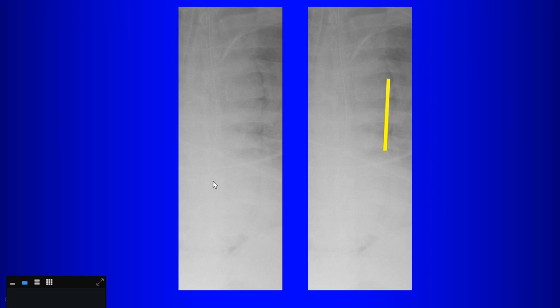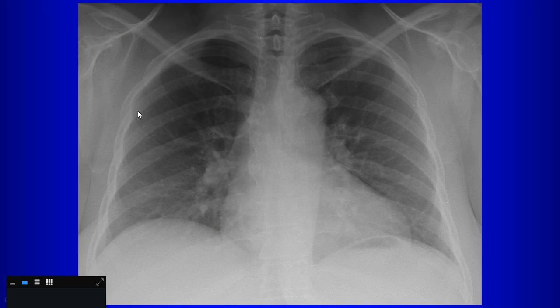What do we call it? This is a Mach effect, right? And if you recognize that at the edge of a structure, especially when there are changes in attenuation or density on an X-ray, you can have these Mach effects, then you can recognize that that's not a pneumomediastinum, that's just a Mach effect.